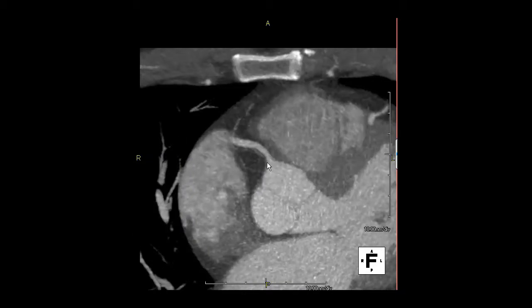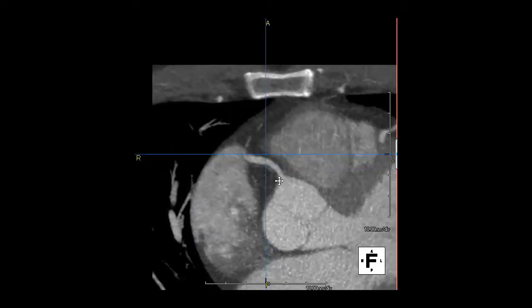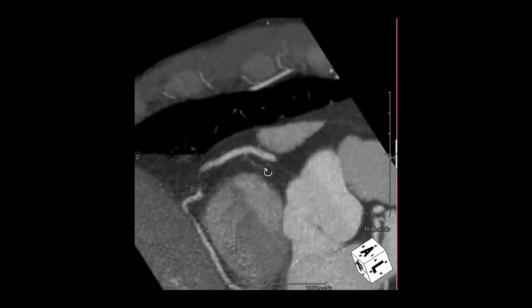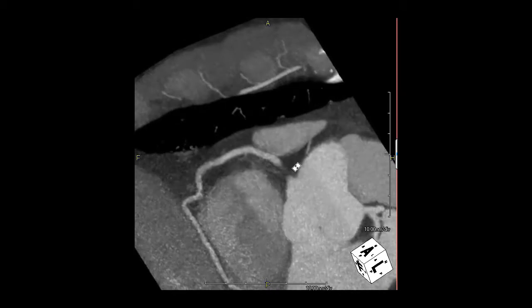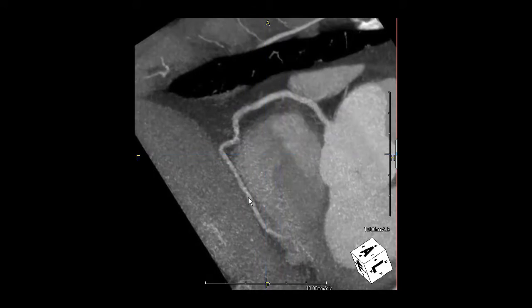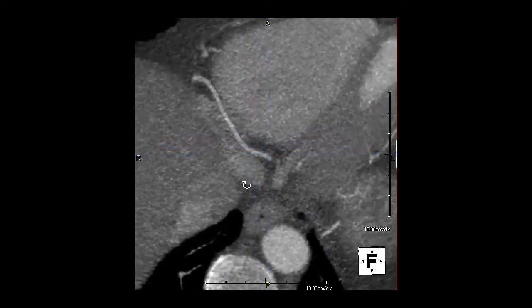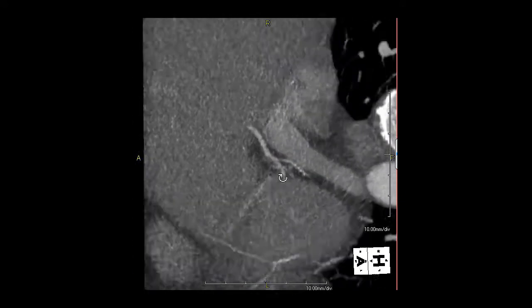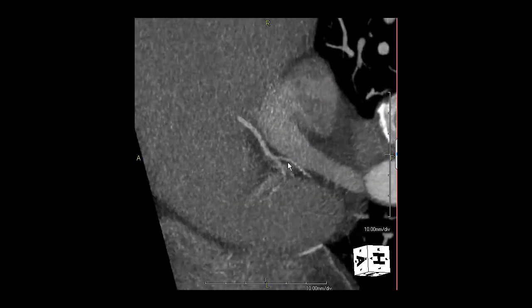This is the right coronary. The ostium appears to be normal. The vessel grossly appears to be normal, although the images are noisy, and it is possible that there could be some mild focal atherosclerotic disease, but certainly nothing that suggests any major problems or complications within that region. The vessel appears to also be normal in the distal end, and very small posterior descending and posterior lateral branch, but nothing that suggests any clear evidence for focal disease.